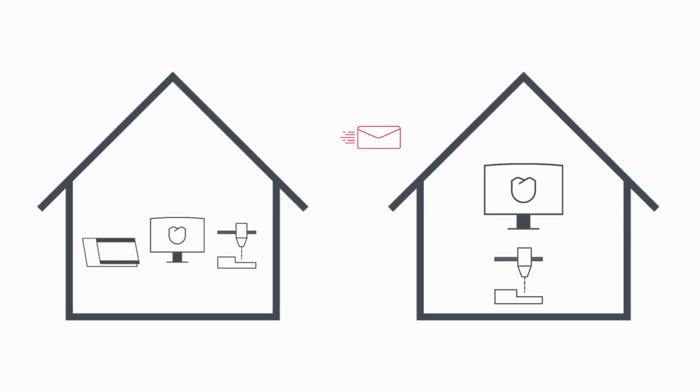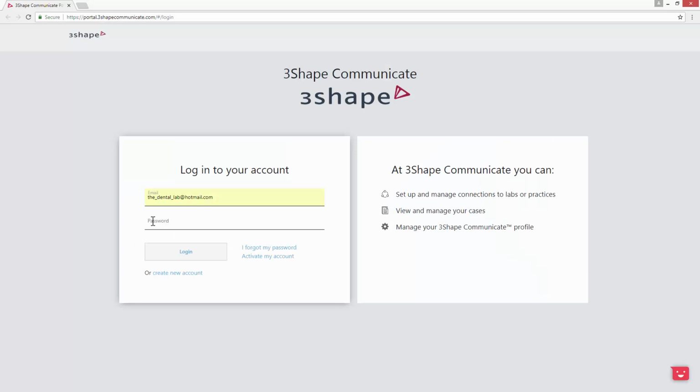However, you can also send it out to third-party manufacturing centers to use its production technologies and experience. This gives you the possibility to extend your portfolio of products and the development of your business. Start with connecting to the manufacturing center of choice.